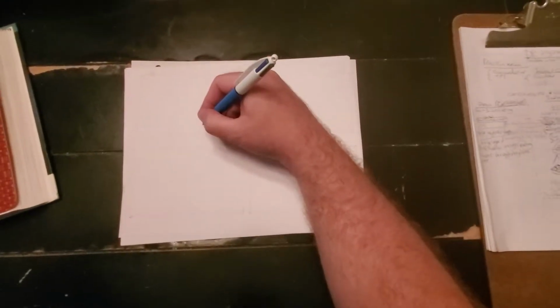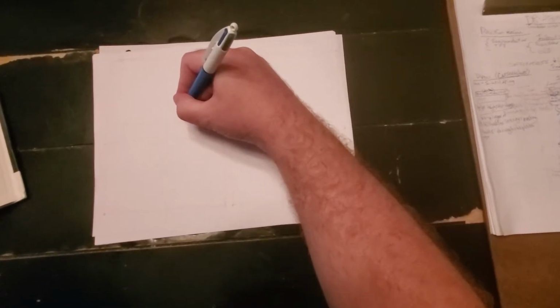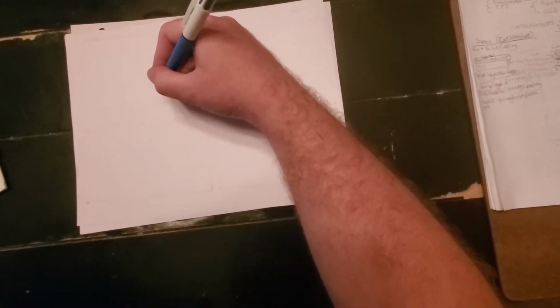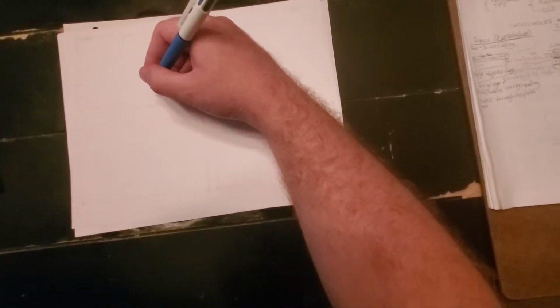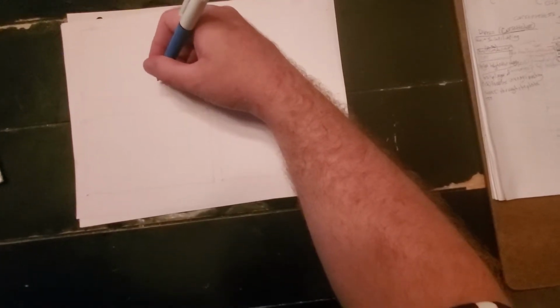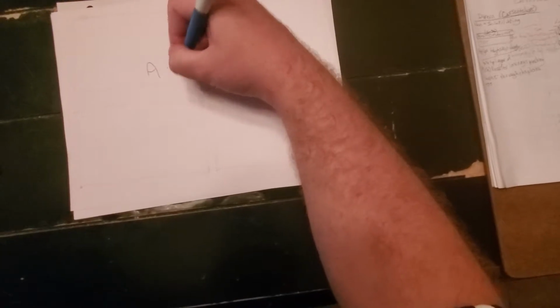The top scintillator layer was made out of cesium iodide or gadolinium, either one of those. And the photodiode layer is going to be made out of amorphous silicon.